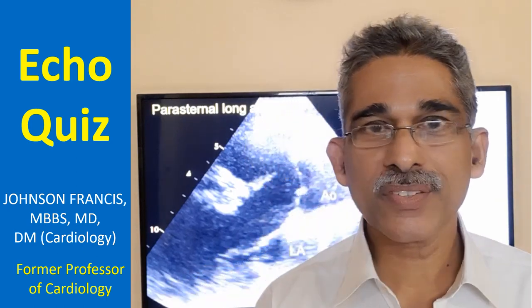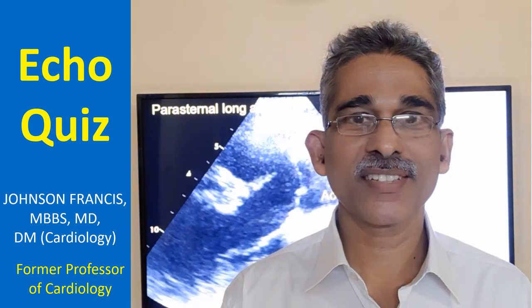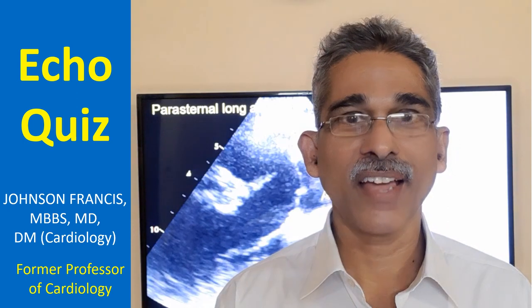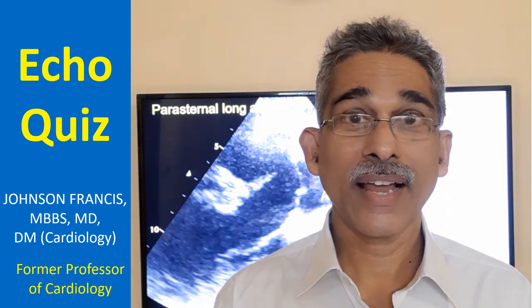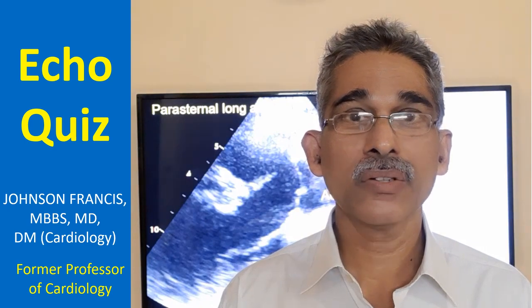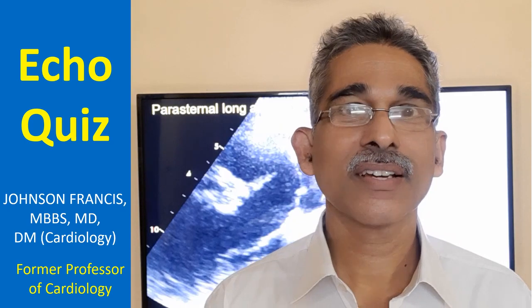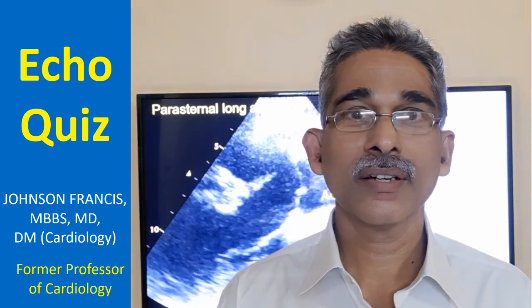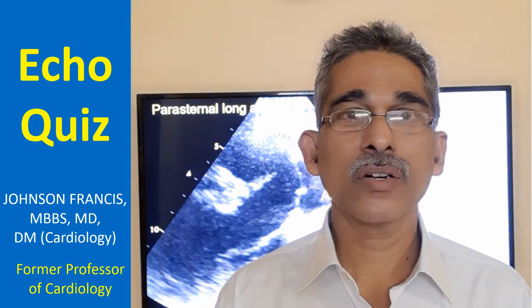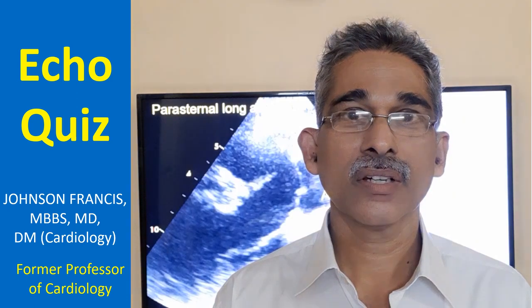Interpreting an echo quiz just from a single frame has a lot of limitations, but still for an academic exercise we'll try. Unlike the ECG, where a single image may be more informative, echo usually requires moving images. And moreover, even ECG requires a knowledge of the clinical background before interpretation to avoid errors.